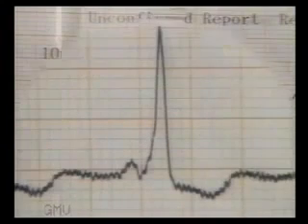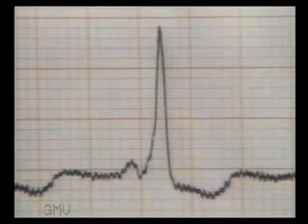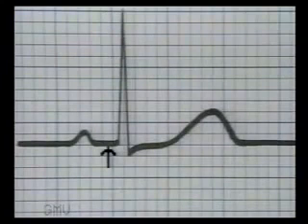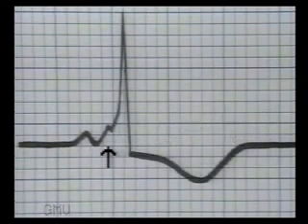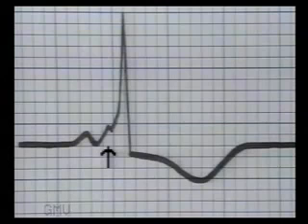It is important to know the presence of WPW syndrome as it often leads to serious tachyarrhythmias in later life. The isoelectric line between the P wave and QRS complex is due to the AV nodal delay. But in WPW syndrome, the impulse leaks to the ventricles via an accessory bundle of fibers called the bundle of Kent. So the isoelectric line between the P wave and QRS complex is replaced by a slurred upstroke.